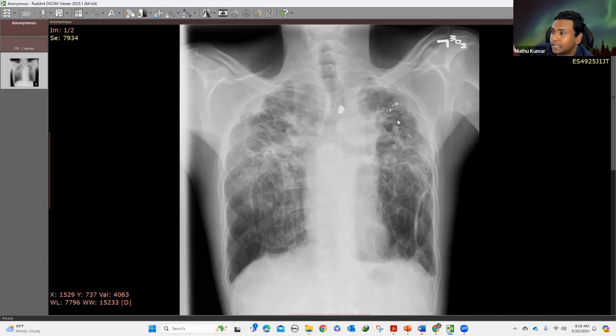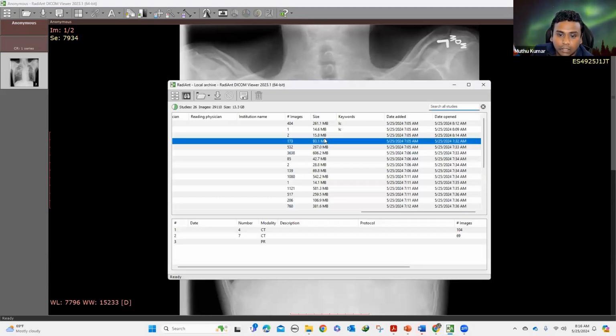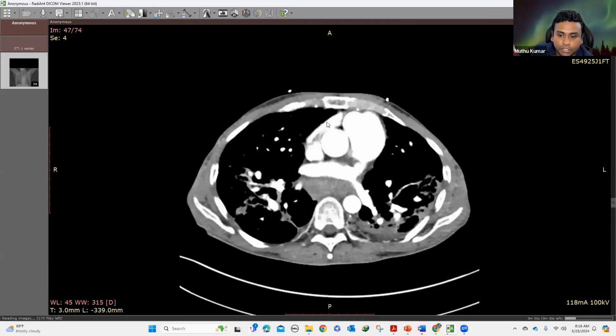This is a patient who has sarcoidosis. Let me show the CAT scan. So that's what I want you guys to take away from this case. Mid to upper lung predominant fibrosis, always have 3 to 5 differential diagnoses in mind. And let me show the CAT scan of this patient.